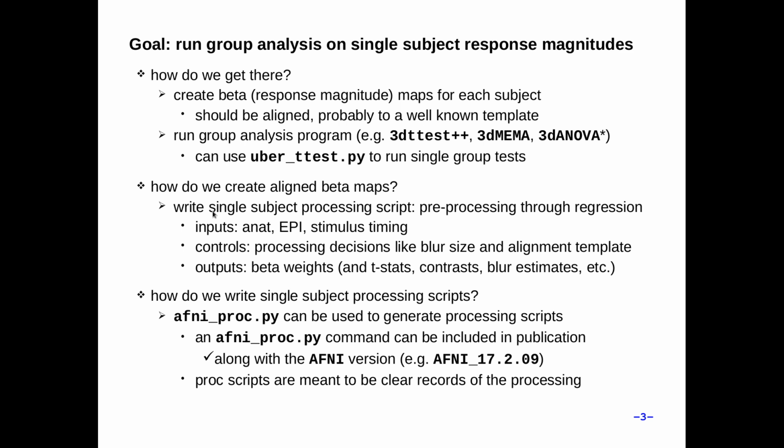More particularly, in the olden days, you'd write a single subject processing script. You would have that do pre-processing through the linear regression. Again, pre-processing, possibly tshifting, maybe many volume registration steps, blurring, scaling, whatever. And then it runs the linear regression, say using 3dDeconvolve or 3dREMLfit.